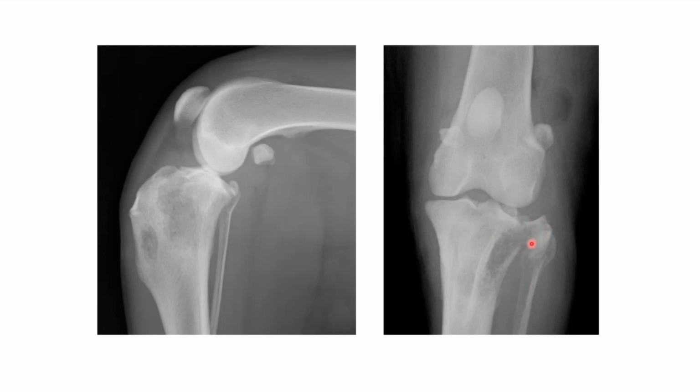There is some evidence of cortical destruction here as well, and the zone of transition is long and indistinct. What's curious about this proximal tibia, particularly in this caudocranial view, is this little fissure line here. So it looks like we have a closed, complete oblique intra-articular fracture, which is on the lateral aspect of this proximal tibia that extends distally and laterally, eventually bisecting this lateral cortex.